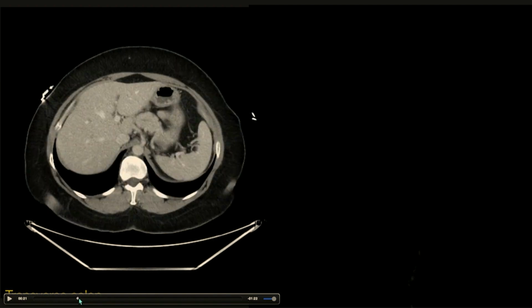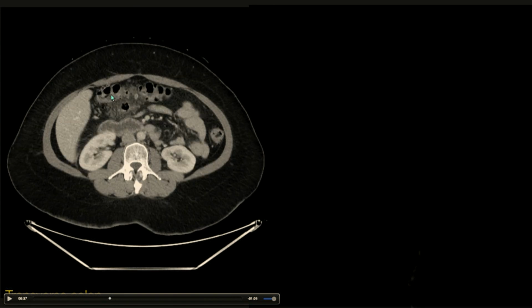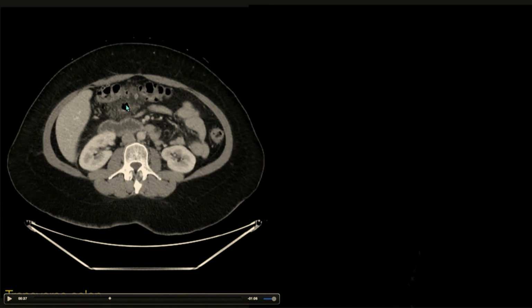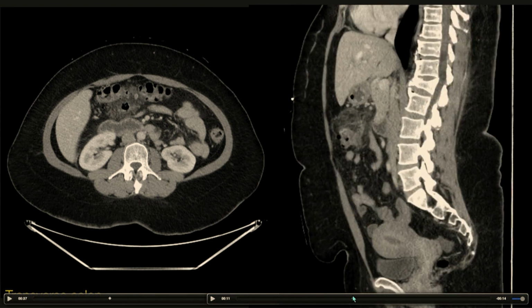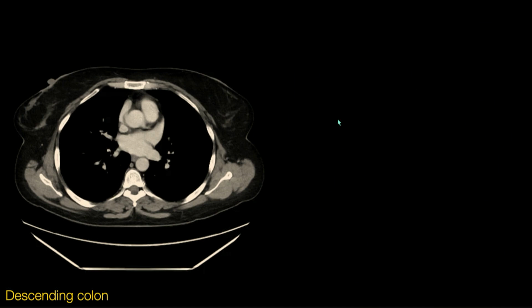Okay, well, I promised to show along the whole GI tract, so we're going to keep it going here. We got transverse colon. So here there's an early perforation with more robust surrounding inflammation than we typically experience. Seeing diverticulitis in the transverse colon is not a particularly common diagnosis to make, but certainly an important one, and highlights the importance of a complete search pattern where you're running the entire bowel in a systematic fashion.